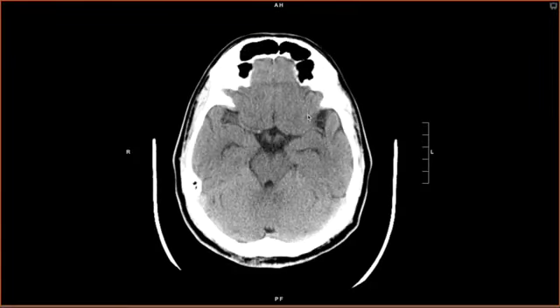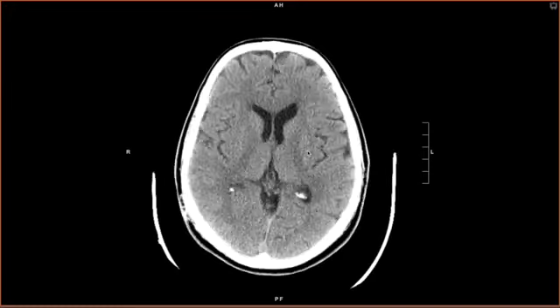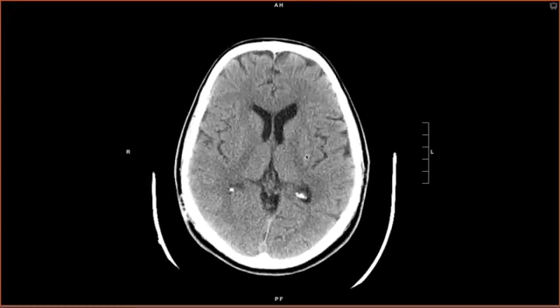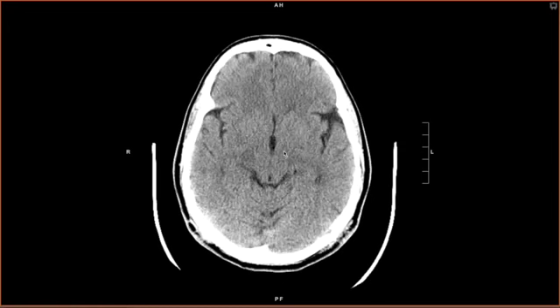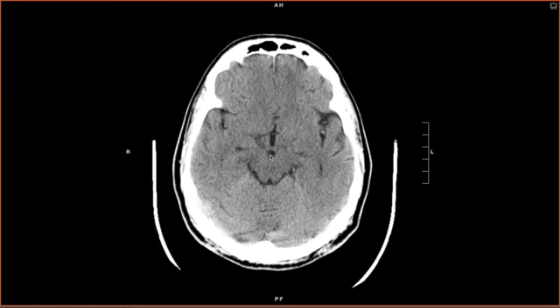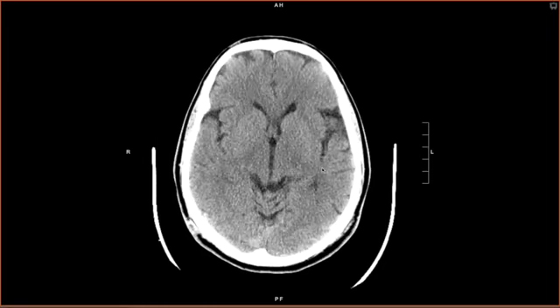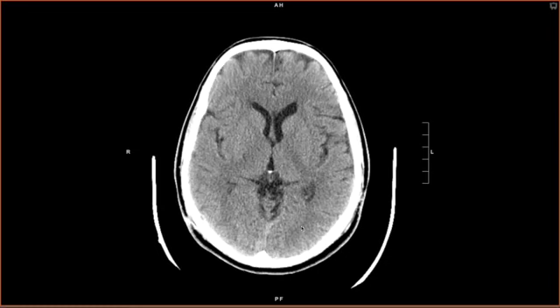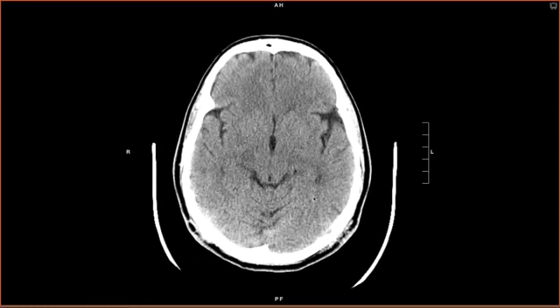Blind spots for blood are more subtle and often in the dependent portions of the brain, such as the interpeduncular fossa. Right here, you can often see very subtle hemorrhage there in trauma. In the sylvian fissures here, in the most dependent portion, you can often see hyperdensity there, representing subtle blood. And also in the occipital horns of the lateral ventricles, you can see intraventricular blood.